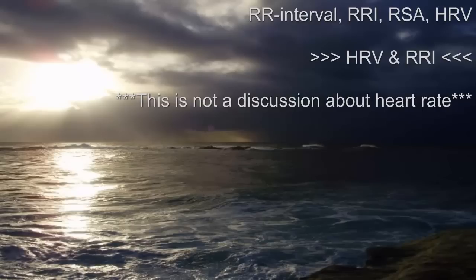Before we actually get started analyzing data and talking about what heart rate variability is, I just want to make a few things clear just for the sake of your understanding. When I talk about heart rate variability, I may throw around terms like RR interval, RRI, RSA, or HRV. HRV stands for heart rate variability. The RR interval signifies the time interval between two successive R waves on an ECG. RRI is simply the abbreviation of that, and RSA stands for respiratory sinus arrhythmia, which is the phenomenon of a variable heart rate based on your respiration. If any of you have taken heart rate, which you have, you've noticed that it speeds up upon inspiration and slows down on expiration.